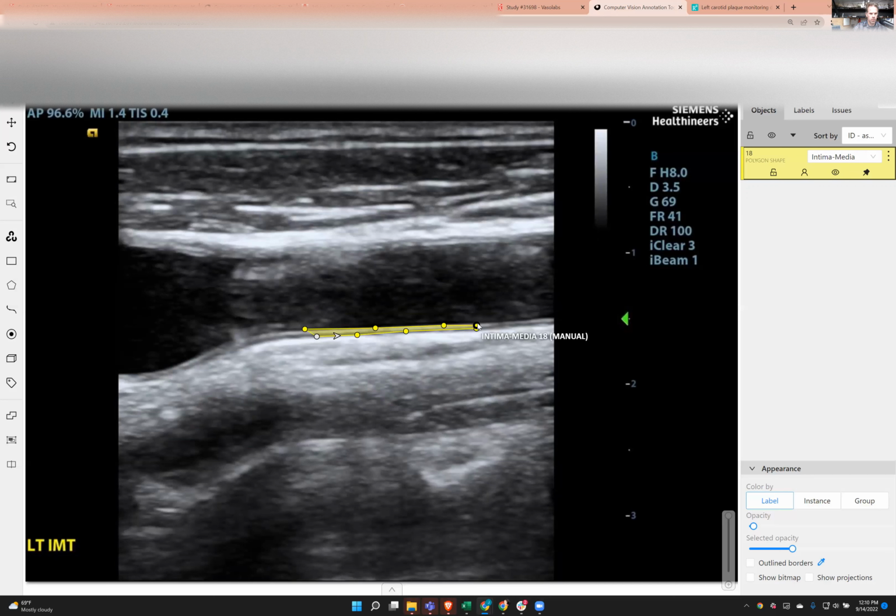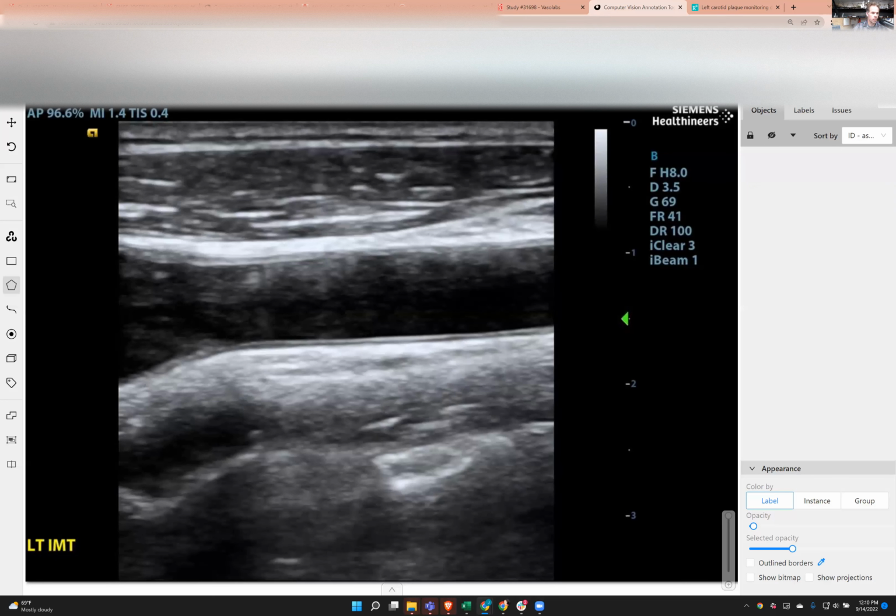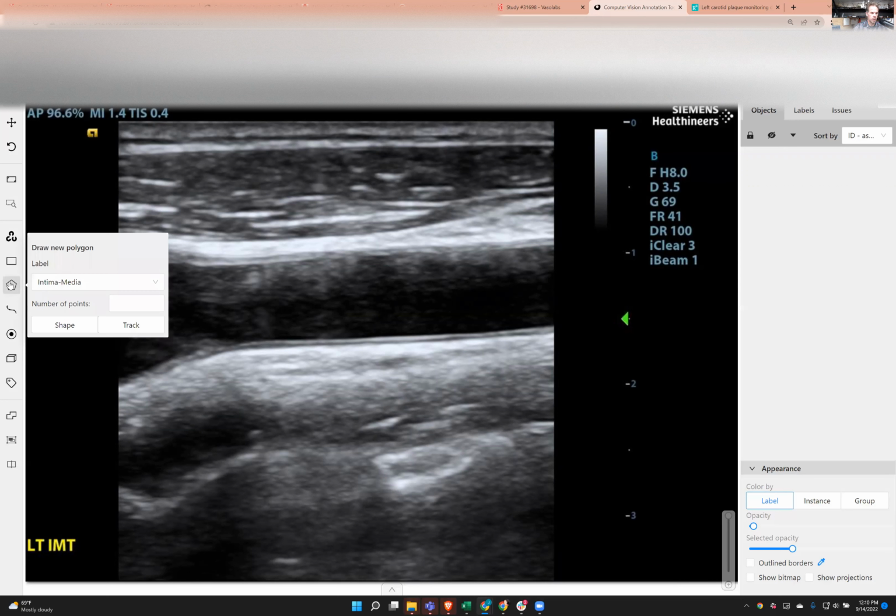A lot of research papers on doing this consistently. You want to control for lighting, make sure no one's hungry. The way we solve some of those problems is having more than one person do what I'm doing right here, measure the intima. Come on, buddy. Yeah, intima.